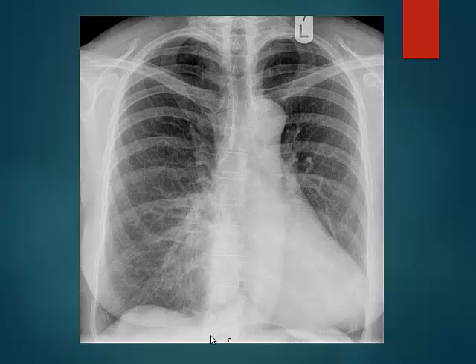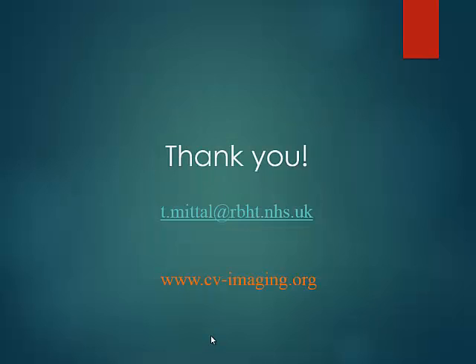So I just showed you a couple of bony problems that can be associated with cardiac diseases. What we have gone through is some of the features of heart failure on the chest X-ray, which is by far the commonest use of chest X-ray in clinical practice. I've shown you some examples of different cardiac chamber enlargement.